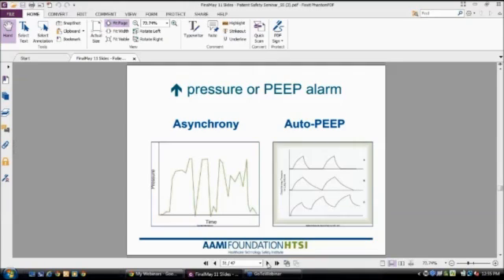So as soon as he gets to the baseline, boom, it's time for another breath from the machine. So the patient barely gets all that gas out before it's time for another breath. And then in C, we can see where for some reason, the expiratory time has been shortened.